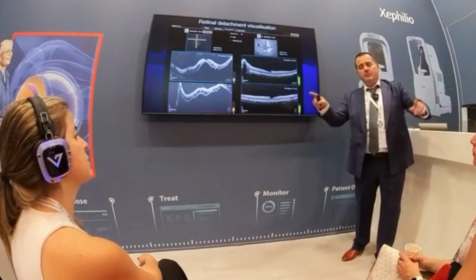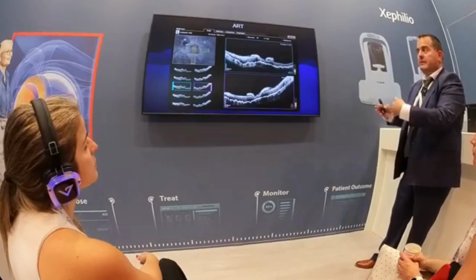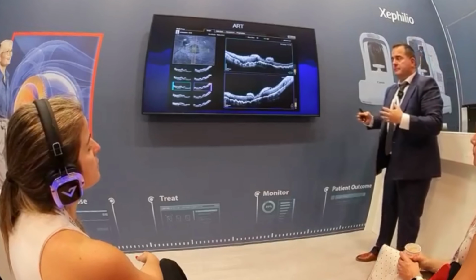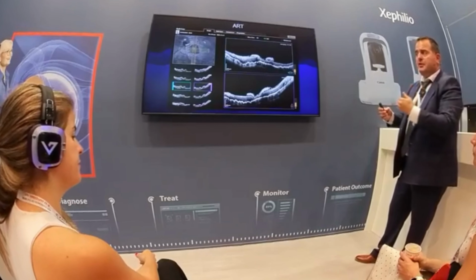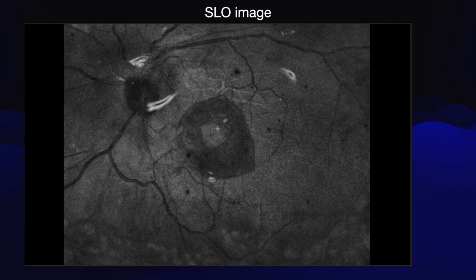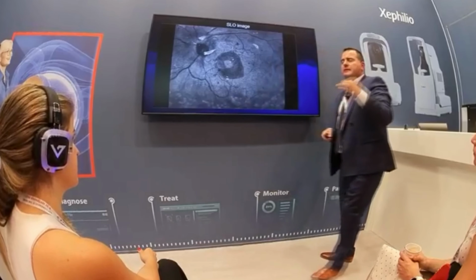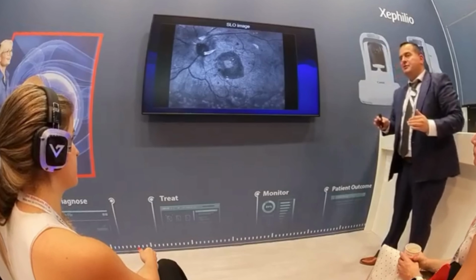And here is one of such cases with a retinal autograft. This is a beautiful piece of peripheral retina transplanted over a huge macular hole. So it is also a good thing to be able to show the patient that you did the impossible to save his eye. Because retinal autograft is something not really traditional, but it's here and it can be done and it can be imaged. So this is the size of the graft. It's a huge one, but it is a really complicated case with a large retinotomy and really nasty PVR. So it was a last resort for this eye.